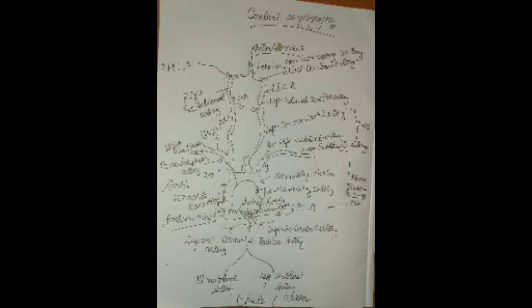So in this session I am going to explain what arteries we look at in the anterior view and what we get in the posterior view. This topic is very important when we do the post processing in CT or MRI. So let's move on.